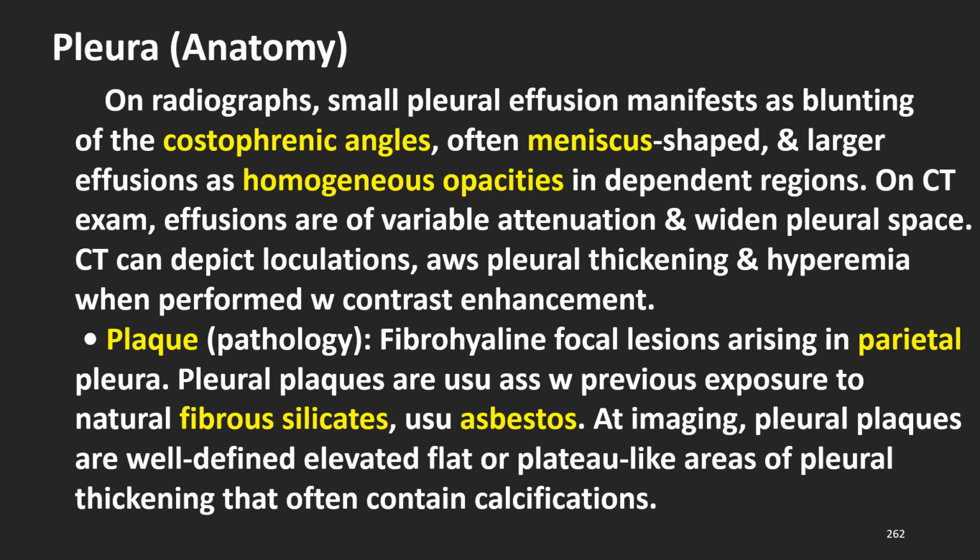Plaque pathology. Fibrohyaline focal lesions arising in parietal pleura. Pleural plaques are usually associated with previous exposure to natural fibrous silicates, usually asbestos. At imaging, pleural plaques are well-defined, elevated, flat or plateau-like areas of pleural thickening that often contain calcifications.